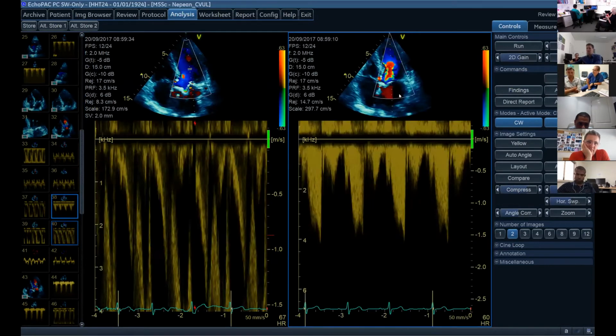So this one here is on the right side of the screen. That's continuous wave. Yes. Well, you probably can't see it as well, but there's no little gate in there. There's no gate like that. And here it's all filled in. So continuous wave Doppler on the right, pulsed wave Doppler on the left. Yep. All right.